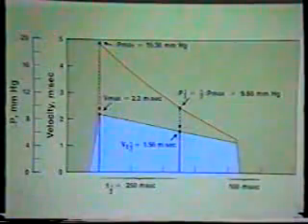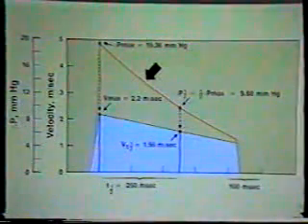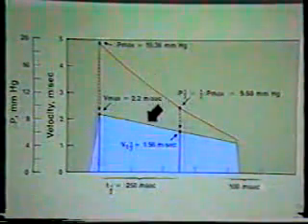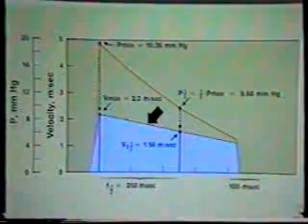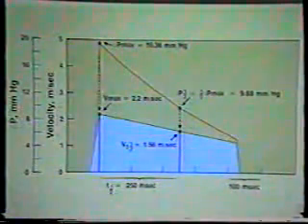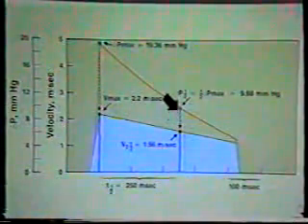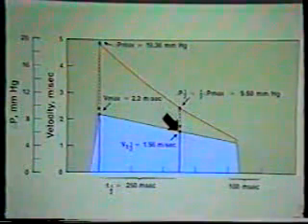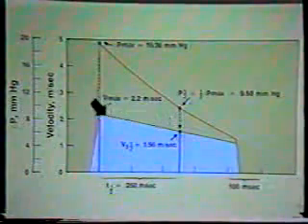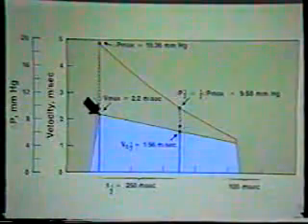It is obviously tedious to determine the pressure half-time by constructing a pressure gradient curve. It turns out that we can arrive at the half-time directly from the Doppler velocity spectrum without converting to pressure gradients. In order to do this, we must be able to locate the velocity point that corresponds to 1/2 the maximal pressure gradient. By simple mathematical manipulations, this point can be expressed in terms of V max, which is a point that we can always locate on the Doppler spectrum.